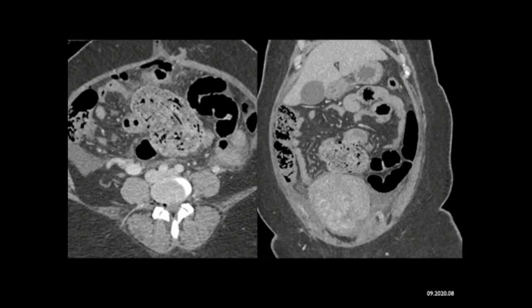And you say, what, am I dealing with an abscess? Possibly. It doesn't look like a bleed post-op. The uterus looks pretty good post-op. But really, when you think about it, the word is post-op. And there's some mottled density and mass. And that's the appearance of a gossypiboma, which is a fancy word for saying something left behind.